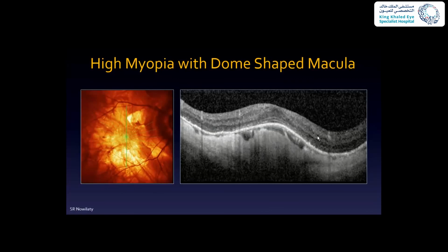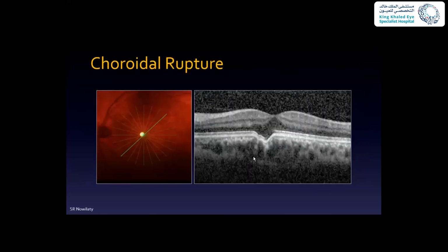The retina usually is not that thin, but sometimes the retina can have subretinal fluid, and can have schisis and epiretinal membranes and all sorts of things that we are now discovering in highly myopic eyes, what we call different degrees of myopic maculopathy, okay? But here, this is an example in which there was an intact retina, but just a very thin choroid and a dome-shaped macula.